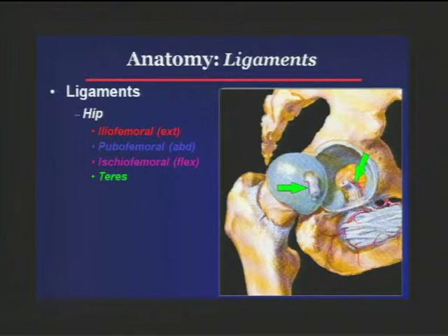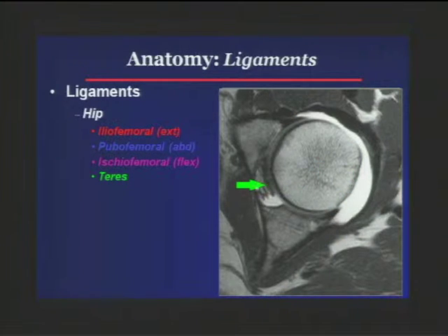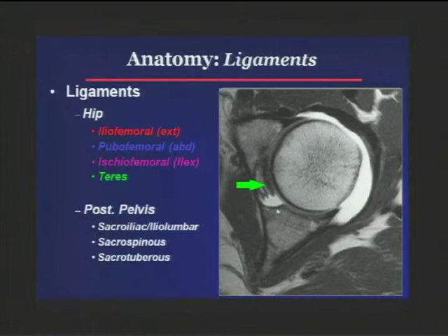Now the ligamentum teres I will take a look at because you can see pathology there. You remember that enters the fovea of the femoral head, and here you see it in cross-section. Notice again beautifully the articular cartilage and the acetabular fossa here with the ligamentum teres.